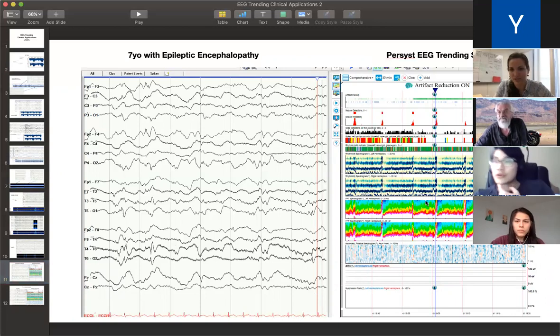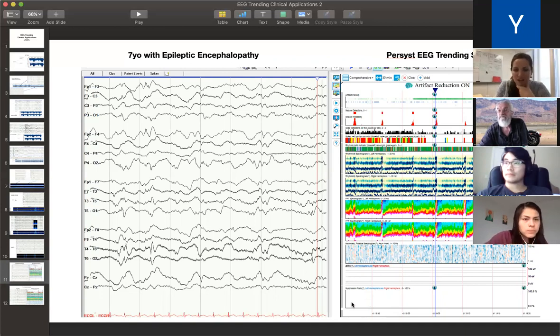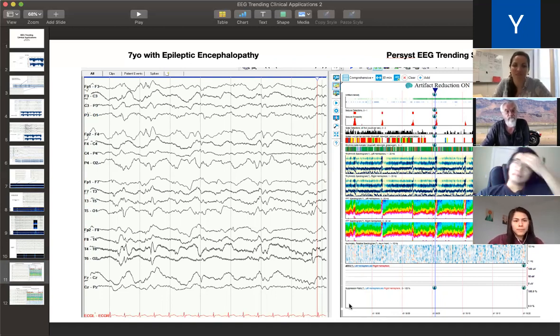So in this graph of the suppression ratio, there's no point at which there's silencing. Is that right? Right. So in this patient, I'm not sure why there's no trend for the suppression ratio. This is, I think, an error. Maybe it wasn't set up to trend that.